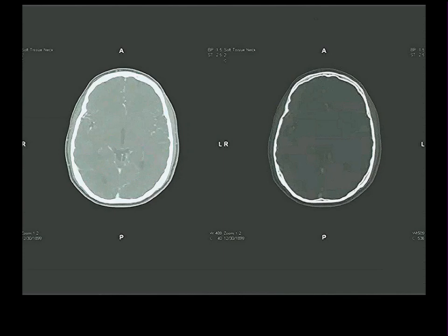Why might you want to do it if you were interested in actually seeing that the bone of the skull is in fact bilaminar with an inner table and an outer table and a diploe in between those two? You can't really see it on this one, which shows too much soft tissue, but if you change your settings, you can actually see the two different layers of the skull bone and the diploe in between them.